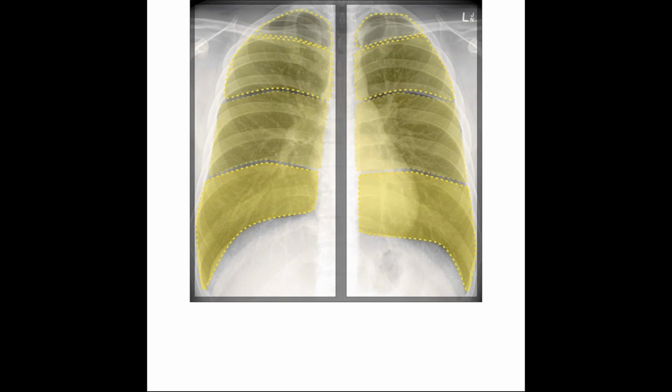Ideally, many of you must have undergone a chest X-ray yourself, or you may have for your relative. The advice given while you go for a chest X-ray is that you have to hold your breath in full inspiration. So always and always we look for a full inspired chest X-ray film for a better view. In a chest X-ray film, when it is a full inspired view, you will see that the diaphragm is in this shape.